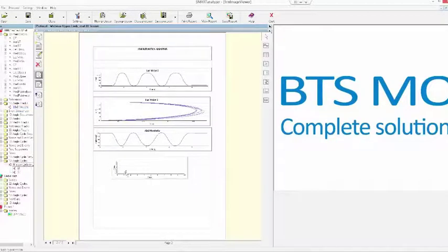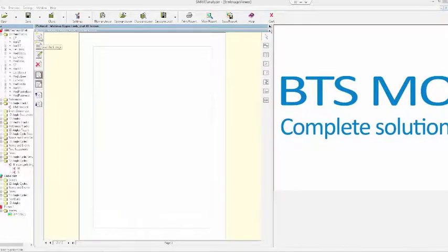Okay, and here I have the mean and the standard deviation. So remember, this was the angle in time, and this was the mean angle between the two defined cycles related to the movement. Okay, so imagine that now we want to also add a legend box. We can choose this option. We can draw a rectangle, and to have the legend, we have just to drag and drop from the name of the trial.